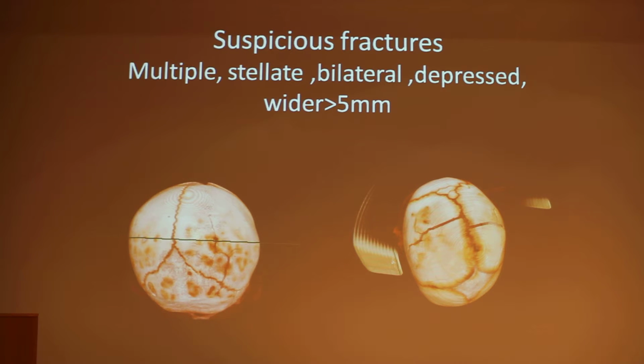Okay, bilateral. The only way to get such a fracture is really to get a trauma smack here on the top, to fall just here on the top of your head. And if the history doesn't match, something is wrong here.